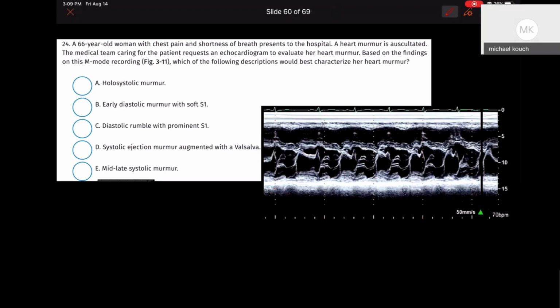Does anybody want to come up with the pen and take me through systole or diastole? Take that as a no. All right. Yanika, if you were here, you would do it, right? Yes. Good, thank you. There's some prolapse there. Good. So we see mitral valve prolapse, right?